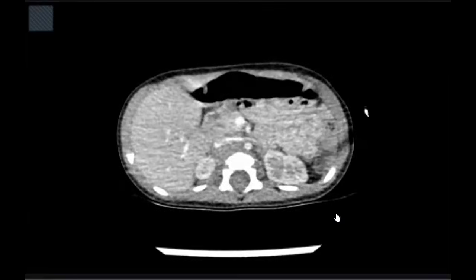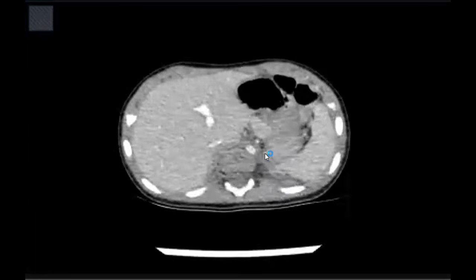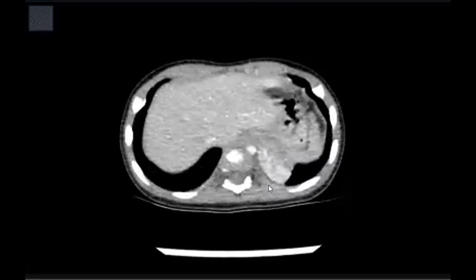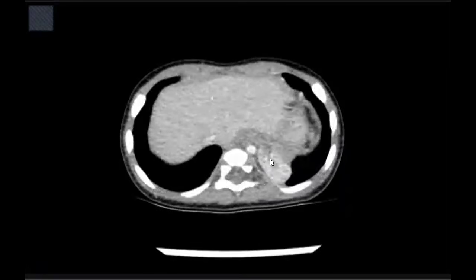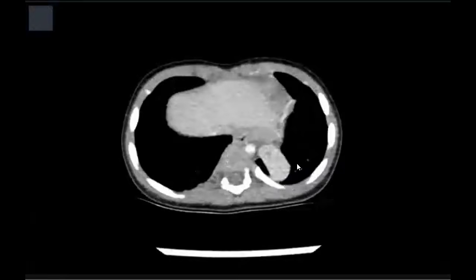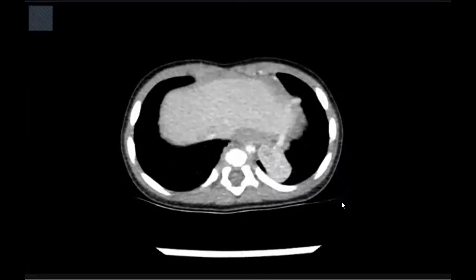Okay, where is the arterial supply of this lesion? This vessel, this tiny vessel. Okay. Where is the venous drainage? And the venous drainage, I'm trying to see. This is the venous drainage. Okay. So it's extralobar. I see this vessel. Okay. Can you trace it? I keep going. Yeah, this one. Okay. So, what's your final diagnosis? So it's extralobar pulmonary sequestration.